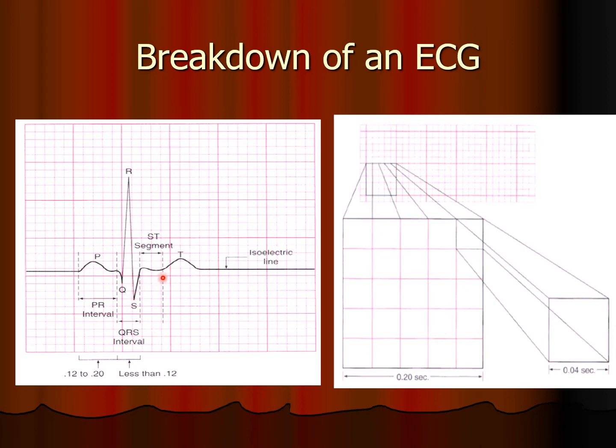All right. And then we have something over here, very important, the ST segment. Okay. And we look at this specifically when we start looking at things like myocardial infarction. And you have had this content before. I want you to remember, it should be pretty isoelectric. The isoelectric line is the resting line over here. And an ST segment should be right around there. It shouldn't be above or below more than 1 block. And if we do have that, we have to start investigating. Maybe there's some kind of ischemia going on, or maybe we actually have a blockage. We have an MI, okay?